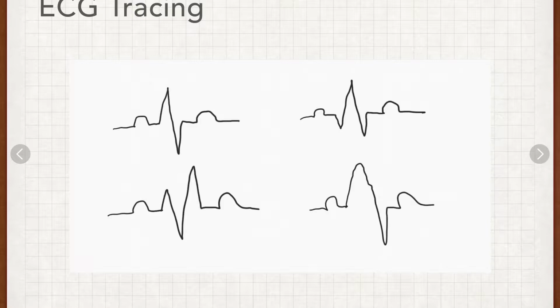Shooting a little video to try to get us caught up on this snow day. Just as a quick reminder of what QRS complexes look like. This is the P wave. We're not going to actually use that in any of what we're doing today. The first positive deflection is R.